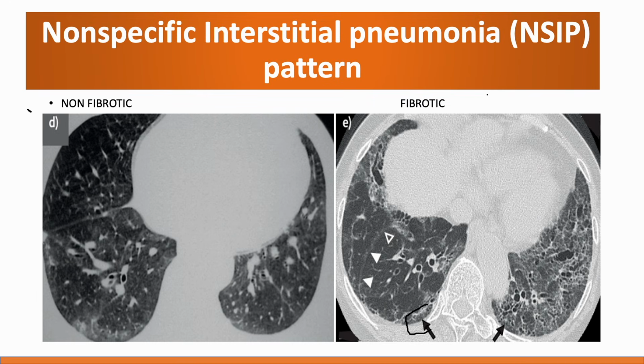So this is what we describe as the subpleural sparing. So this is present. It's symmetrical, it's bilateral, and there is some lower lobe volume loss. And we also notice in a lot of cases that the fissure is displaced because of the volume loss.